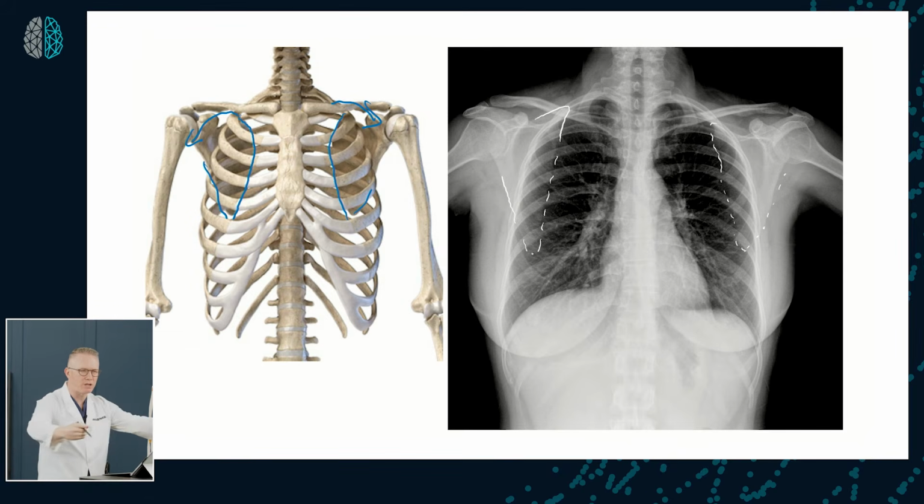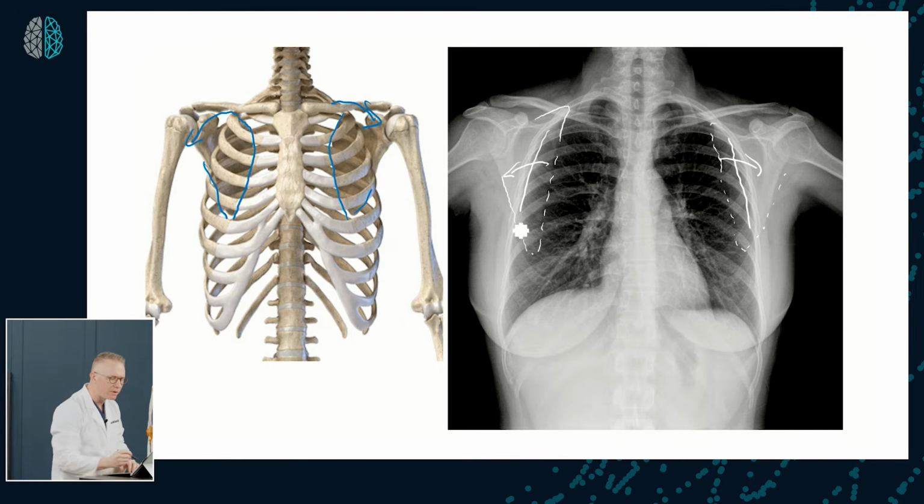Because again, if they were reaching around to grab onto those handles, the scapula would be moved out further and be more on the periphery of the lung field and out of the point of view, okay? And that's helpful. That is a quick identifier that I use a lot of times in helping me to assess. Plus, I also know the patient who got the x-ray in most cases, okay?